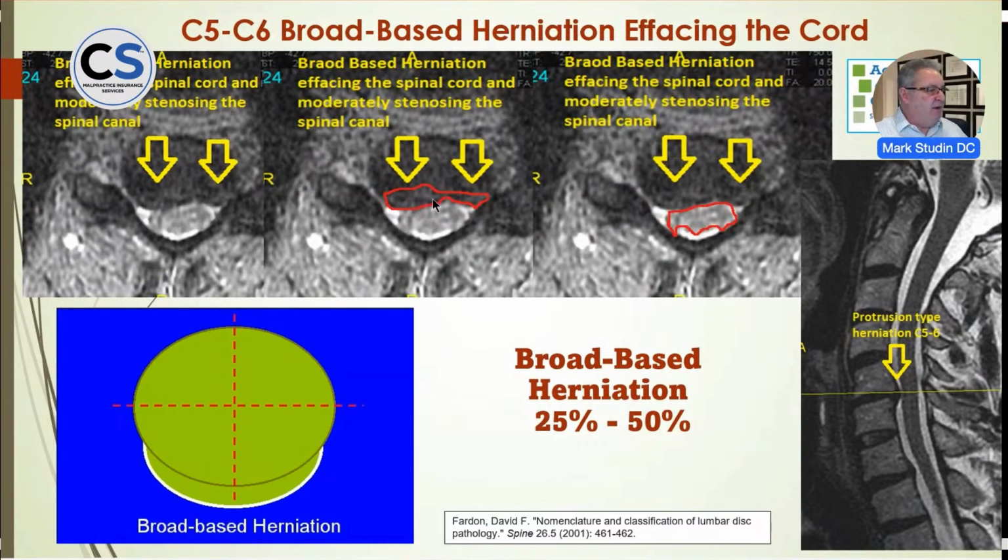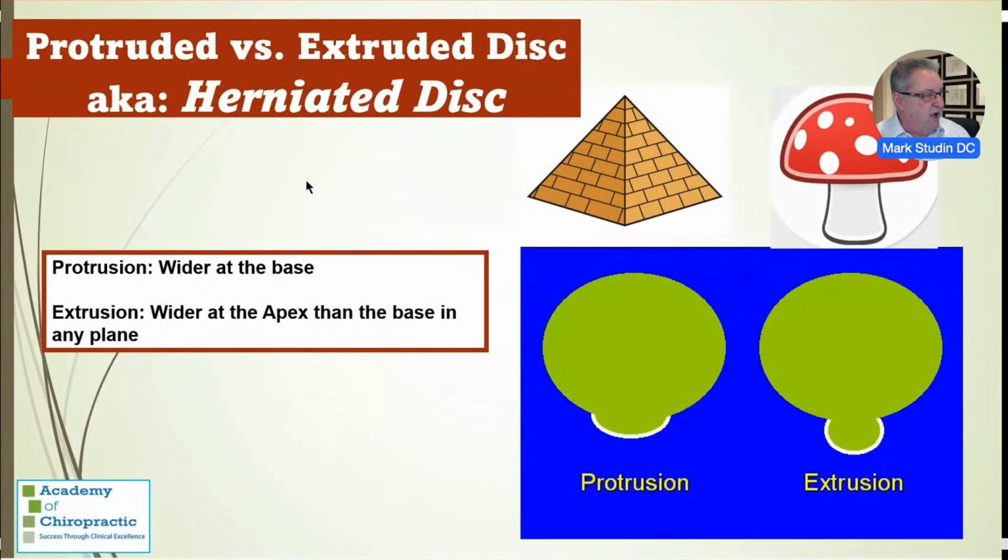This is a bilobular herniation in a broad base scenario. And you see how crazy jagged it is? It's not like a perfect ellipse. This is a sack of jello going in every different direction. So here's what it looks like here, but here's what it looks like here. And the sagittal will help clearly define what's going on. No one image is going to give you your picture. Everything has to define what's going on.